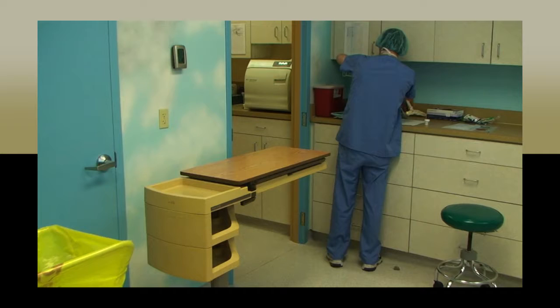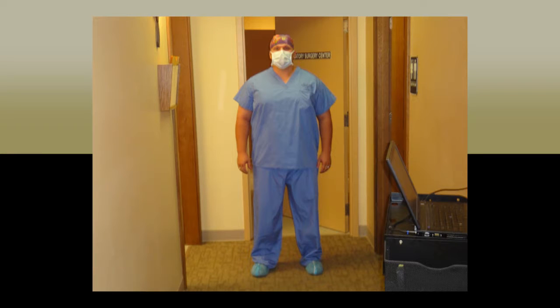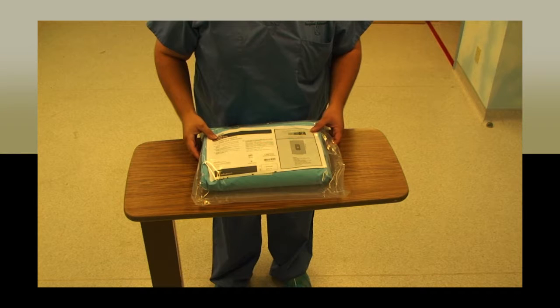Do your best to establish a normal routine for opening instruments and fields so that the job is thorough yet efficient and remains sterile. A sample order is shown here. First, ensure you are properly dressed in surgical scrubs, mask, hat, and shoe covers. Start by opening the back table sterile field and extremity pack.